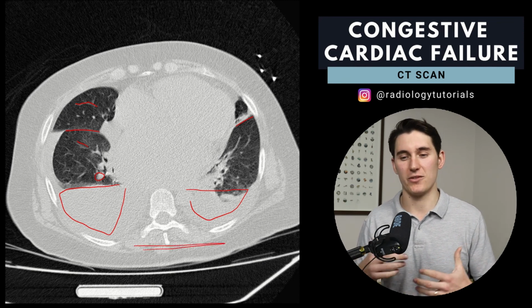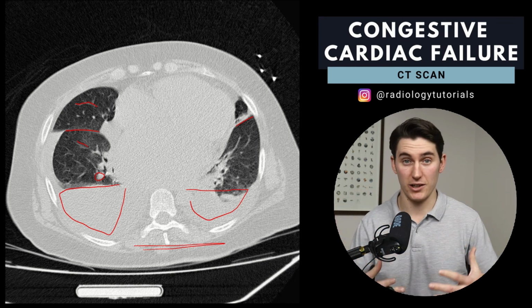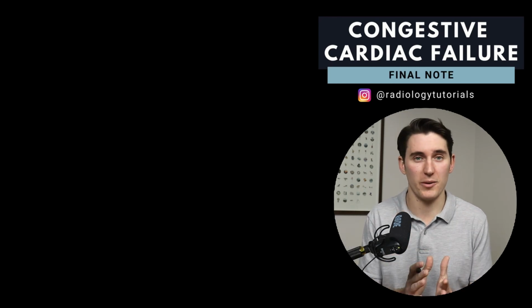And that's another way to differentiate: is this a dense infective consolidation, or is this fluid that can flow freely within the lungs? So that's all for pulmonary edema.